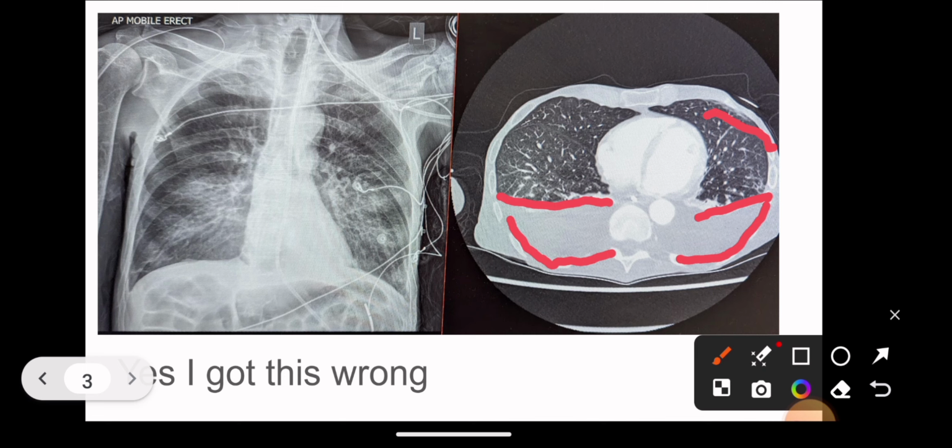Whereas down here you've got the edge of the lung and then something water density in the space between the lungs and the rib cage, and that would be your pleural space, and therefore he has very significant bilateral, almost 30 to 40% or maybe even more in places, loss of lung space to pulmonary edema. Not pulmonary edema, pleural effusions. Even I get this wrong when I'm saying it. So significant bilateral pleural effusions, as evidenced by CT.